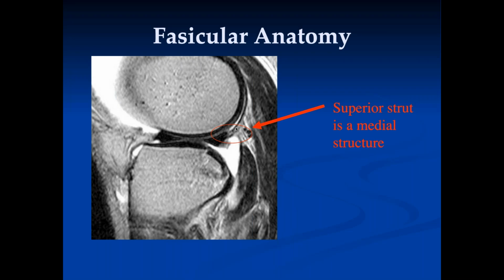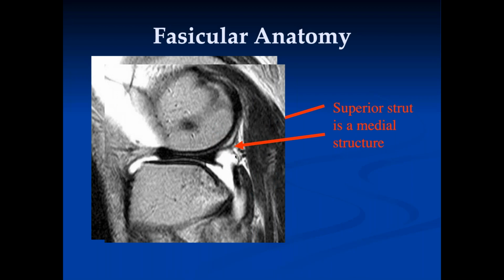And that's a medial structure, because this does not extend laterally, because you have to have a defect in the peripheral attachment to allow the popliteus tendon to come down through. Then there it is too. There's a superior fascicle, and this is the hole for the popliteus tendon.